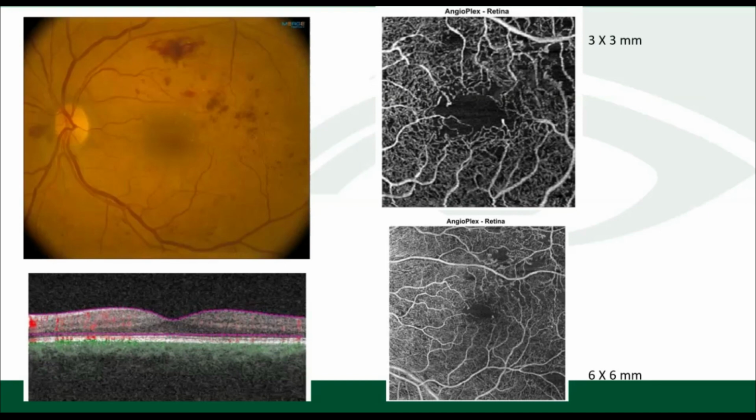I think I'm very concerned about this patient, especially given the progression that you've shown in this case. And I think all the patients that you referred, obviously, is very appropriate to be evaluated by a retina specialist. I would be concerned that there might be actually early proliferative changes in this patient. So I would consider getting maybe an FA on this patient and then instituting possibly treatment.